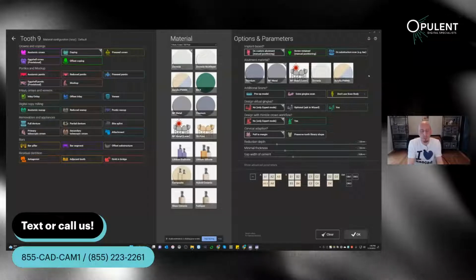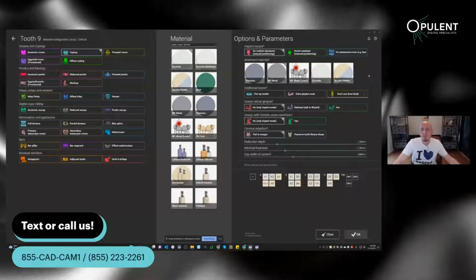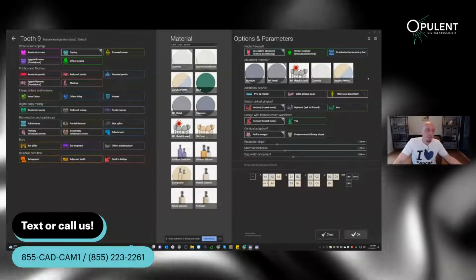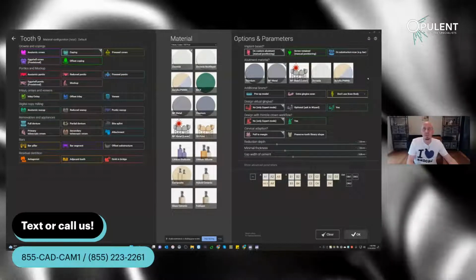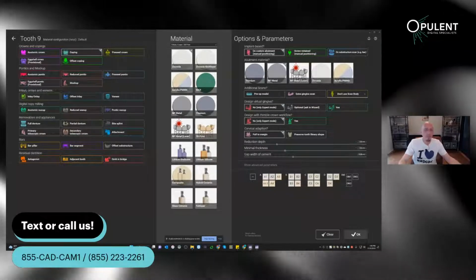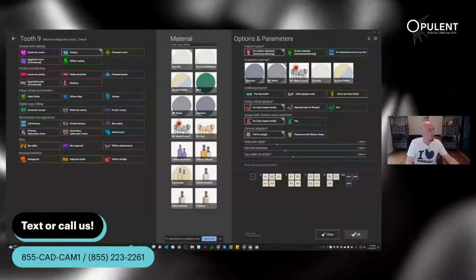And I want to show that because it is really a nice option that you can go in and change the library. And if worse comes to worse, if you can't find the correct library, if these three options haven't worked, I then had libraries which friends gave me where they're like, yeah, I know about that problem. Call somebody up or whatever.